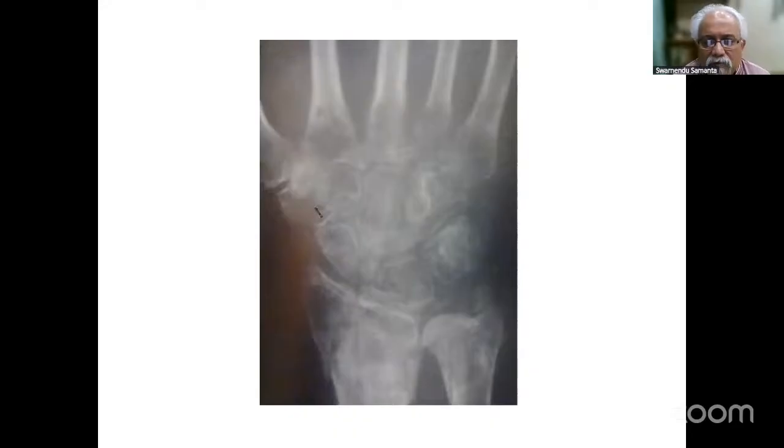So I am giving you the hint. This is a 55-year-old lady who had a distal radius fracture, and she was managed with manipulation under anesthesia, and a below elbow cast was there for 6 weeks, and at 3 months' time she has come with a swollen stiff hand with this X-ray. I think we'll start with Rajan.